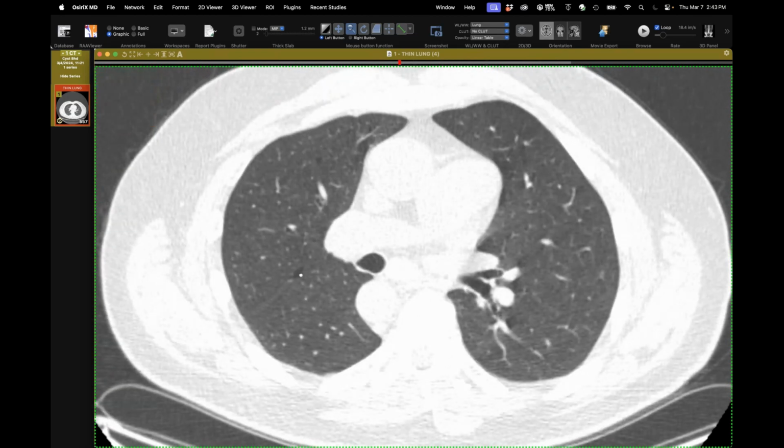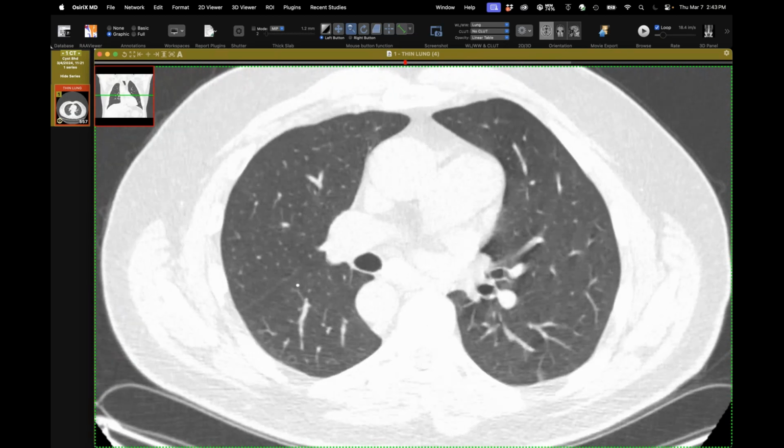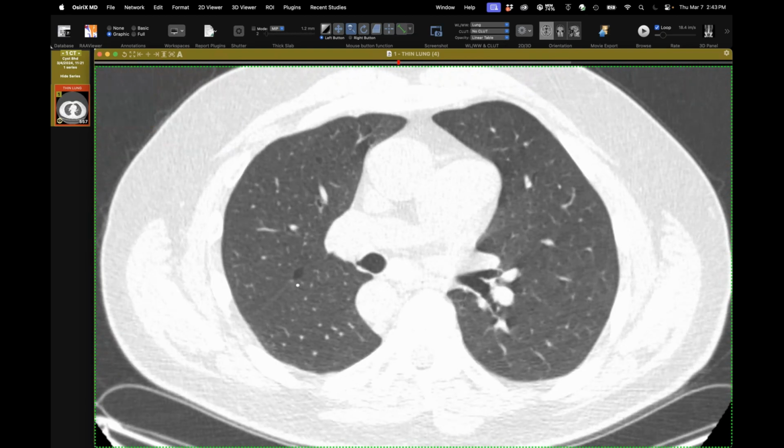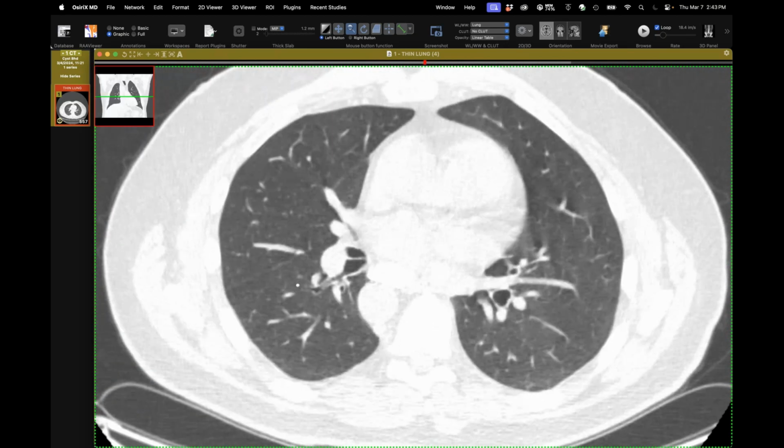There's one there. Sometimes you see them, and I don't know where they are in the lung, if it's right on the fissure, or if it's actually subpleural and along the fissure. Yeah. But if they've had a pneumothorax in the past, I guess it could get loculated. I mean, like this tiny one even here.